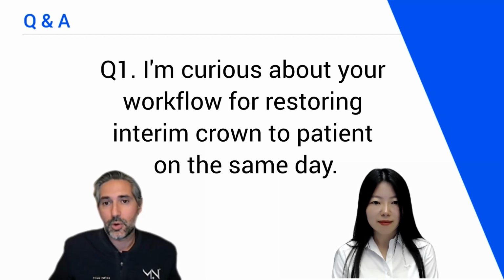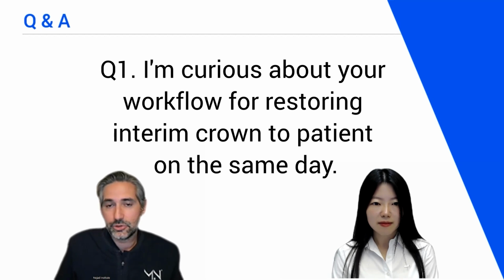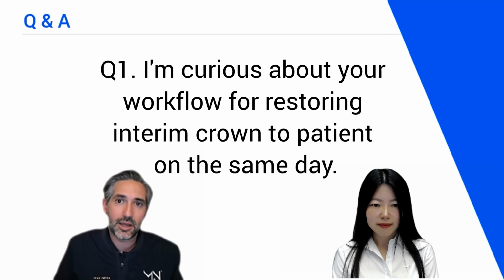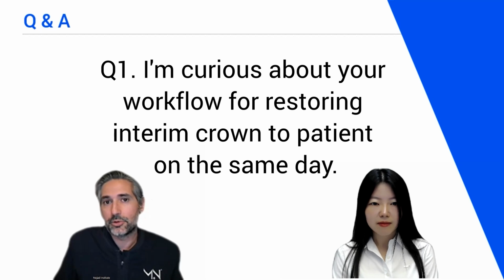But if you're doing quadrants or larger, I do like to do 3D printed, especially when I have a pre-op design or a preliminary design, so that I can be very true to that. I can also make sure that if we've opened the vertical or digitally planned the case, we can be true to that throughout the treatment. So in the last full mouth case I did, I had printed the provisionals for the case so that I could be very true to the design, make sure the occlusion was right on. So that's when I'm doing 3D printed, but otherwise I think the time benefit for 1 or 2 is still not there yet.